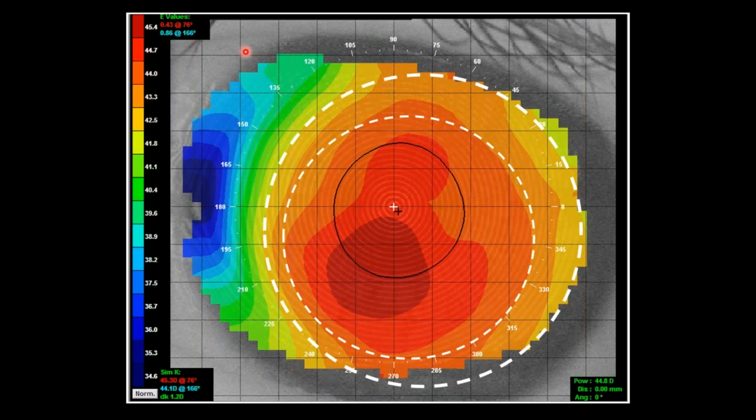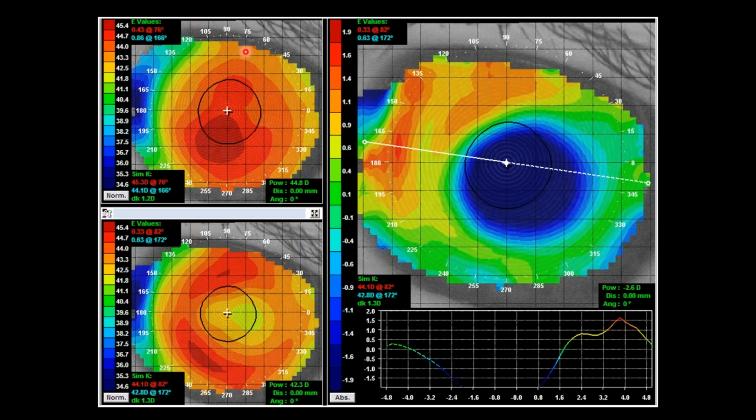Let's take another example, and we might draw circles around some of the contours where our lens might find its equilibrium. And in this case, the patient appears to have a peripheral corneal shape or cap of the cornea that's decentered a little more temporal on this left eye and inferior. So when we do CRT lenses on a patient like this, we wouldn't be surprised if we saw the treatment zone riding slightly decentered. Now, would we try to modify it?